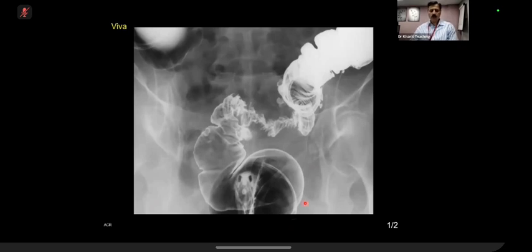And I remember when I used to do a barium enema list, I have not seen any list in which all patients might not have a few diverticula. So there must be some genetics and there might be some dietary factors. And that is why for your exam, it's one of the most important films, diverticular disease and the complications of it. So when there are diverticula, there can be diverticular stricture. And again, if you read your books, it will tell you that there is hypertrophy of the muscularis propria. So where there are diverticula, there is hypertrophy of muscularis propria.